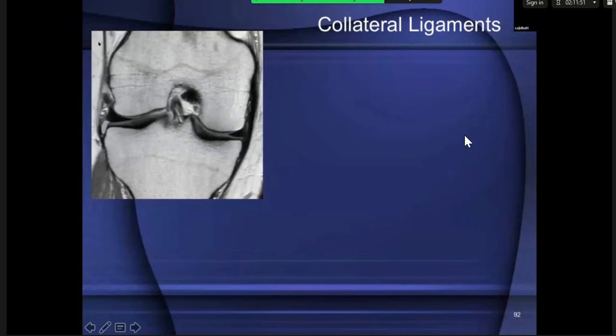The lateral collateral ligament, on the other hand, has got more of a fibrofatty tissue separating the peripheral margins of the lateral meniscus and the lateral collateral ligament. Remember, in this space, we've also got the popliteus tendon on the lateral side. One important point to remember is that the tibial attachment of the medial collateral ligament is almost a hand's breadth below the upper tibial articular surface.